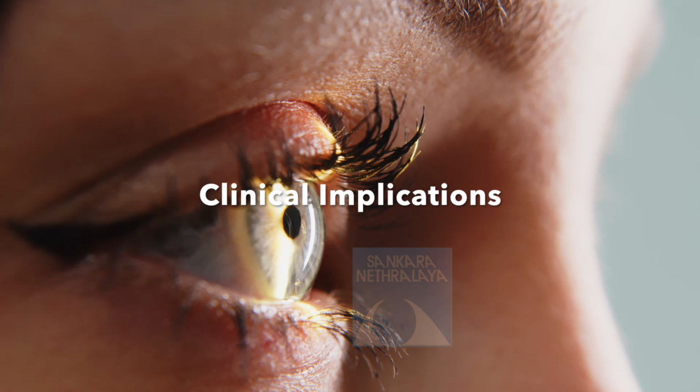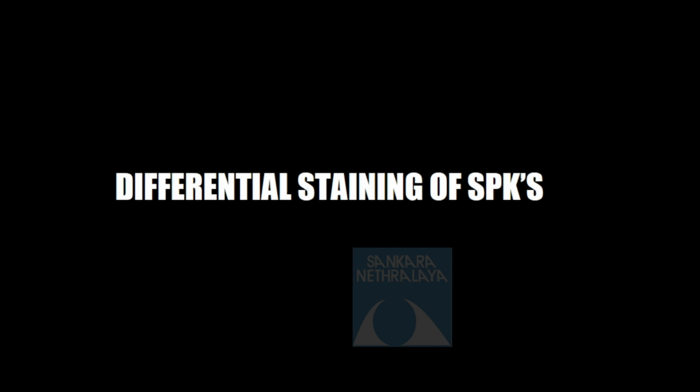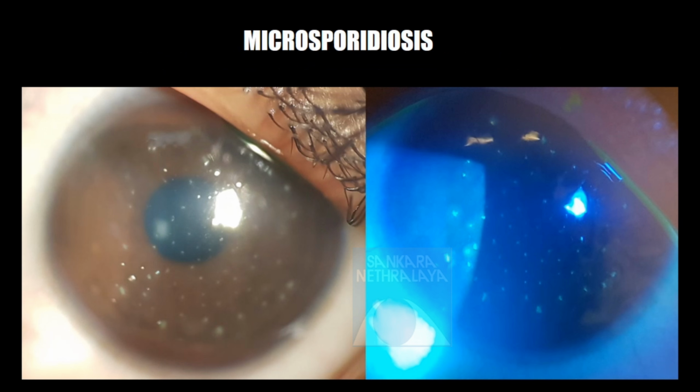Moving on to the clinical implications, fluorescein can differentiate staining patterns seen in superficial punctate keratitis. In Thygeson superficial punctate keratitis, there are multiple coarse round to oval epithelial lesions that stain with fluorescein. These lesions are often central and bilateral. Microsporidiosis presents with coarse raised white epithelial lesions that show irregular fluorescein staining.